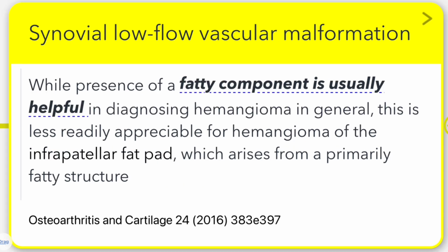On T2 weighted fat-suppressed images, the lesion is hyperintense with signal voids corresponding to abnormal vessels. Additional MRI features may include fibrofatty septa and muscular or fatty invasion without a significant mass effect.